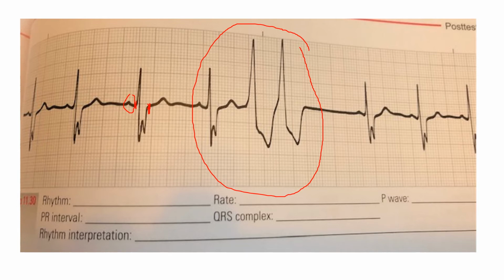Did you also notice that there is a U wave? If you look very closely, there is a U wave. It's very low voltage, as they usually are, and sometimes it takes time to really see it, but usually it would be due to a hypokalemia. And that can sometimes explain why PVCs occur when you have a hypokalemia.